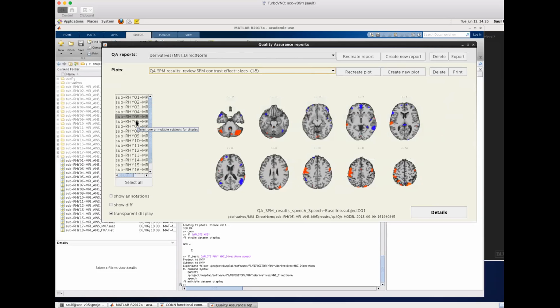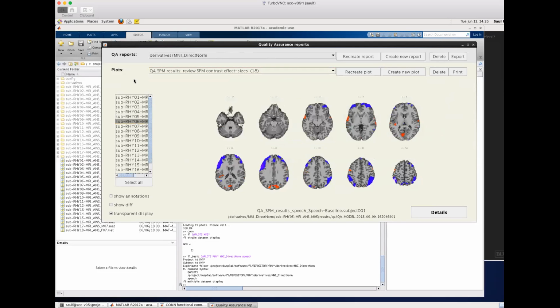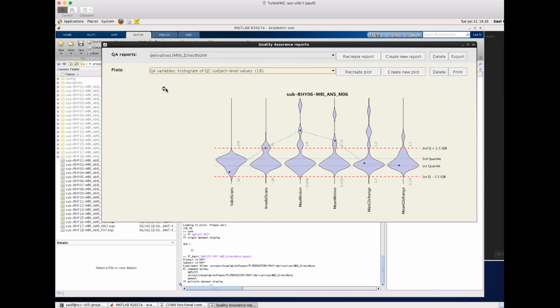For the next one, look at where the activation is, the size of the activation, and whether it looks patchy and noisy or not. This one, for example, looks a little noisier because all of those frontal, lateral bands look like motion-related activation. It might just be that the subject has motion correlating with the task. I haven't done that yet, but I'll probably add a plot that shows motion-correlated task activation.